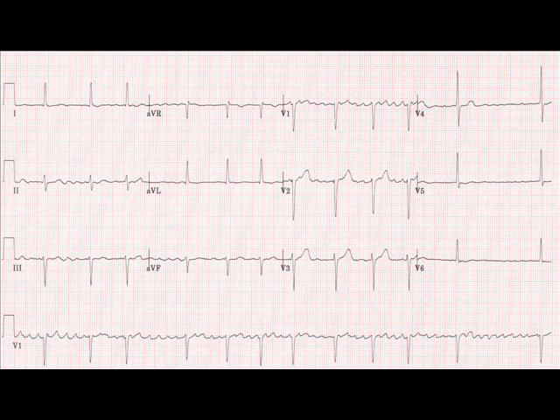As you now know, what I'm looking for is one clear rounded P wave per QRS complex and T wave. I'm not getting that. This patient is not in sinus rhythm. If you look between the QRS complexes, what you see is this constant undulating, fibrillating, wobbling baseline. And when the heart rate is normal, you should see a flat line somewhere, the isoelectric line, certainly at the end of the T wave and before the next P wave. You certainly don't see that here. It's constant churning electrical activity within the atrial area.